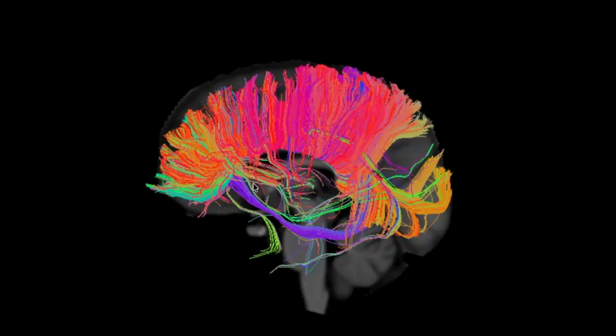This one goes temporal. Small tapetum. Tapetum, correct. So this is the tapetum of the corpus callosum. And you can see we have crossings here with the inferior fronto-occipital fasciculus. And that's where it didn't get resolved. So we're jumping the tract, and then it comes back here, and that's why we're picking it up in this case. Okay.